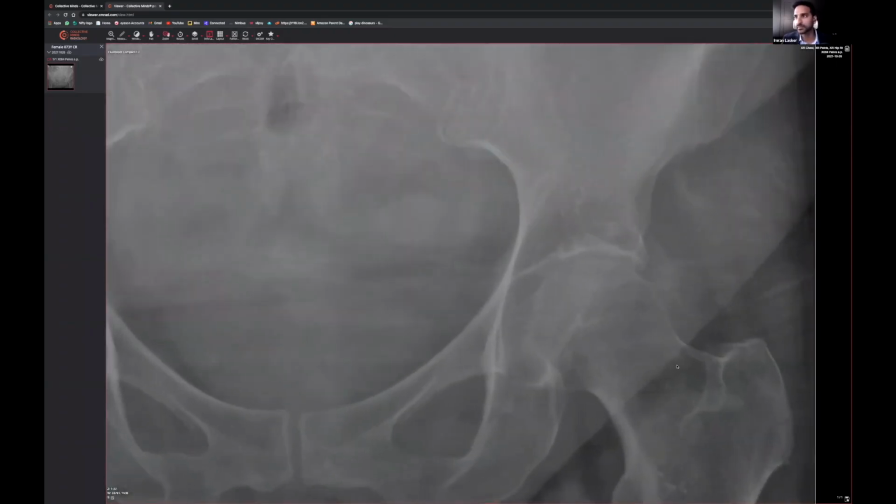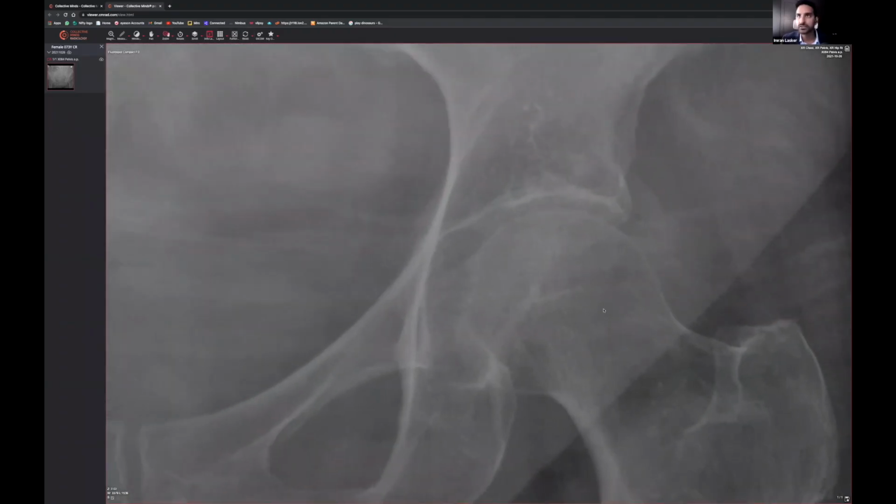Yeah, well done, you picked it up, I can see that. And have another look at the trabeculation. You can see that this is all diagonal like this, right? And that's normal. If you have a discrepancy in that diagonalness, if that's a word, then you're probably looking at a fracture. The other thing that I've seen people not realize sometimes is that there is this cortex, right?